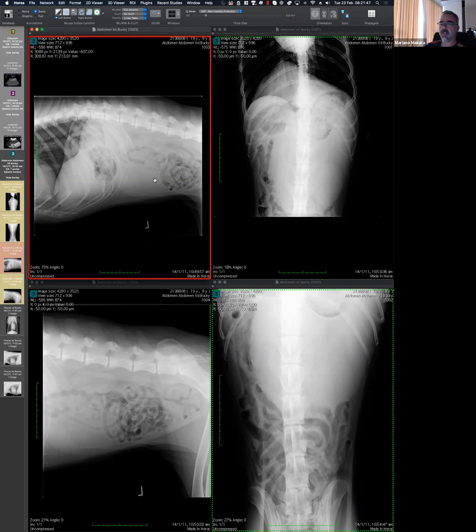I think in this scenario it's important to know if there is fluid or not. And that comes back to the discussion: is this a mass effect or a mass? How convinced are we? How likely do we think there's fluid in addition to something looking like a mass?